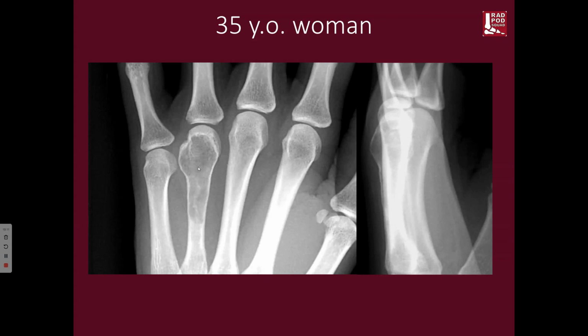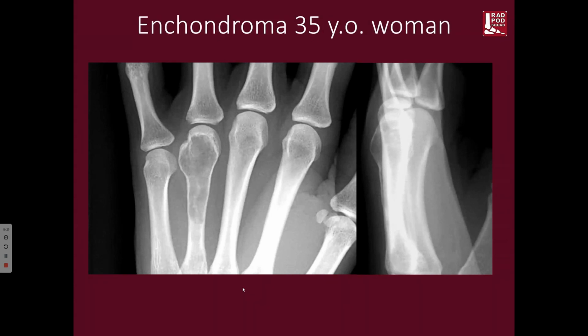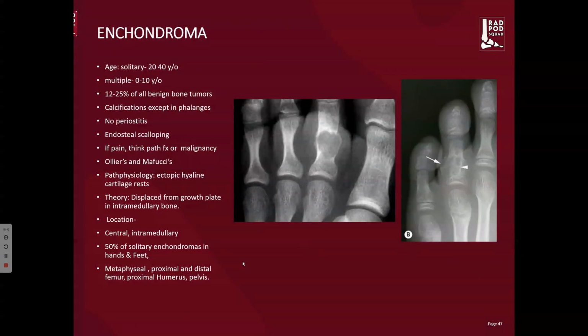any matrix. I'm looking for osteoid, chondroid, fibrous. And I can't be sure there's not fibrous matrix here, but it also could be lucent from a lucent lesion. And drawing from what is most common here, this is an enchondroma in a 35-year-old patient. And when the lesion is as long as this one and occupies the length, they will assess it for curettage and packing. So generally speaking, lesions over 2 centimeters in length will be assessed for curettage and packing.